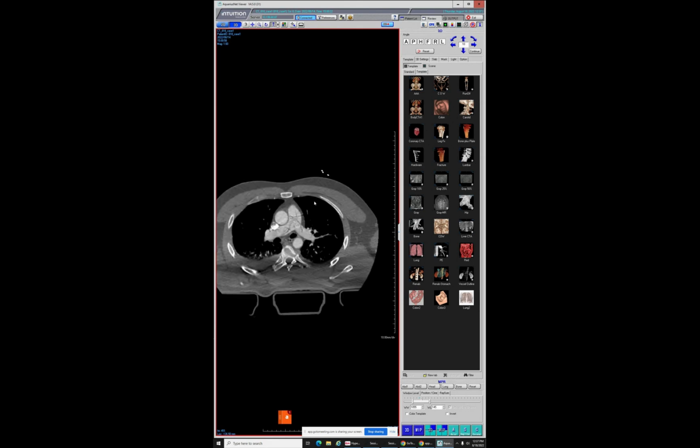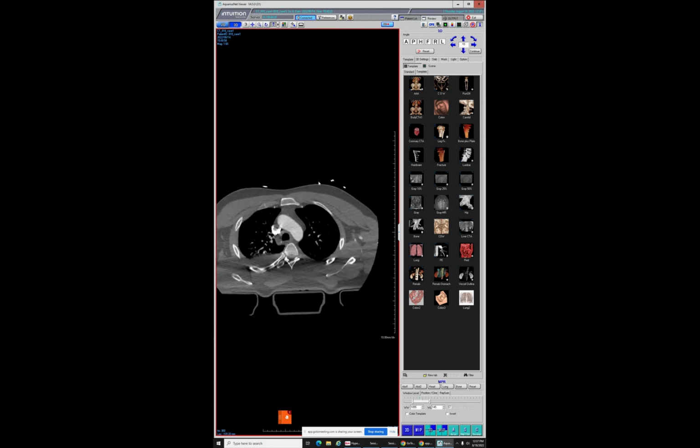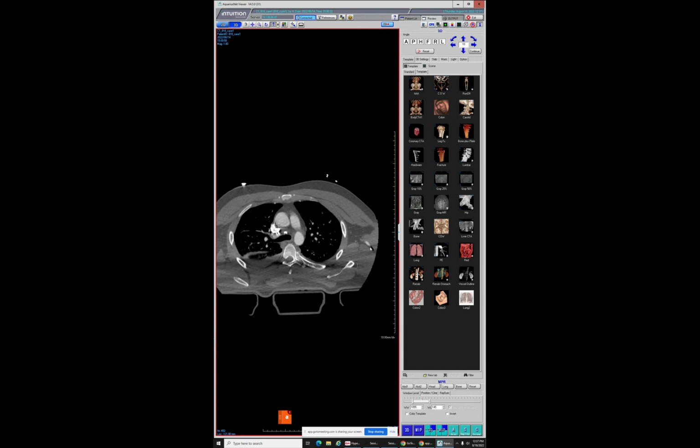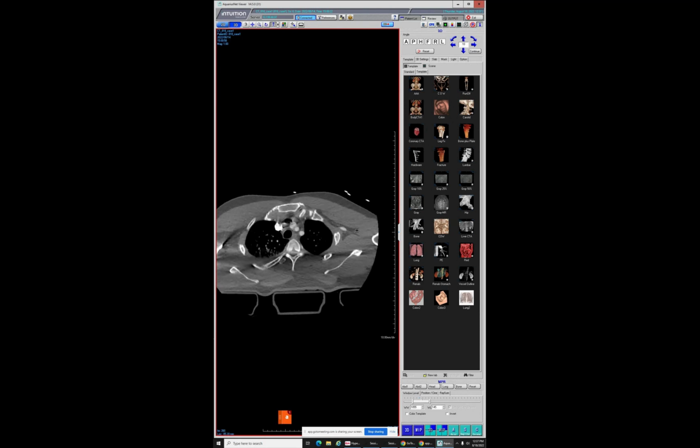But interestingly, if you look, the fracture was on the left, the injection was on the right. But there's air actually in the left, I don't know which vein that is. It's beyond the axillary vein, brachial vein, I'm not sure. Yep, brachial. Yeah, there's actually air in the brachial vein coming from that open fracture.